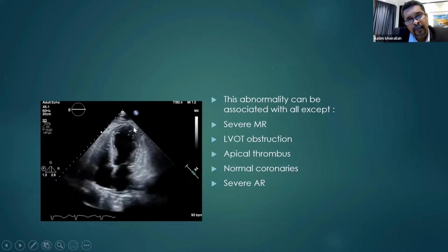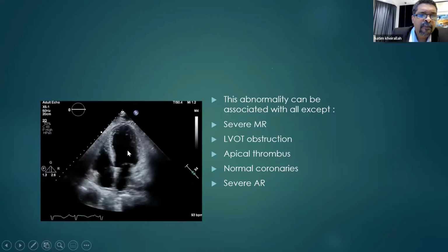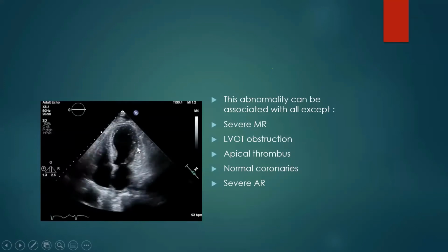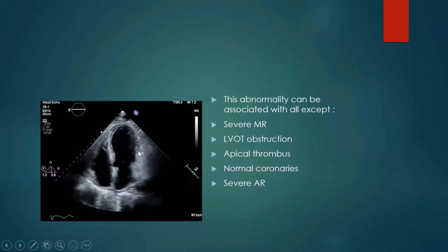More than that, look at the apical aneurysm. Apical hypokinesia. Aneurysmal apex. And if you focus further, it's more than apical aneurysm. Actually, the aneurysm starts from the mid downward. So both the mid segments and the apical segment. Yes. Okay.